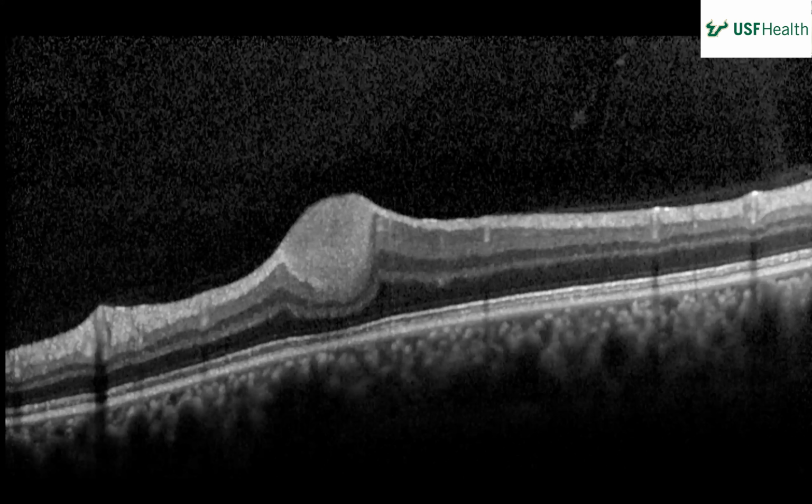That's pretty good. It's a tough one. Yeah, there's no classic picture of this like what we normally see. This one looks a little different from how it's supposed to look. I feel like the classic ones we see in a flashcard or something are usually more peripheral. No, this is posterior. I think it's the location. There's one thing about this one, look, I think is a little different. Okay, I'll help out a little bit.